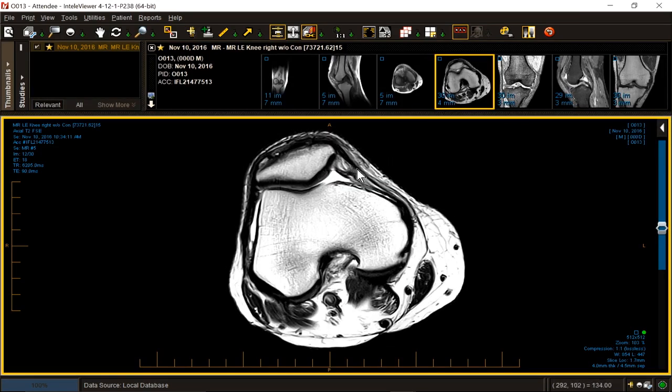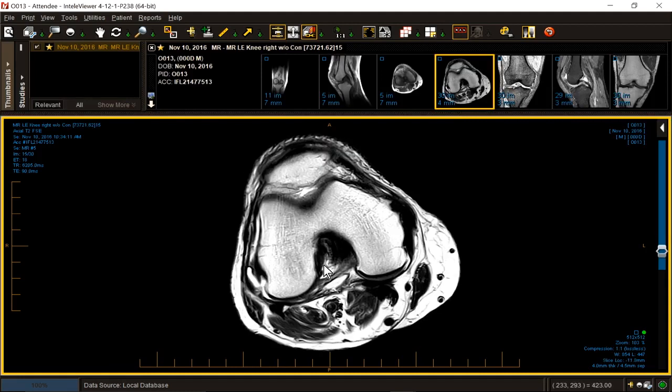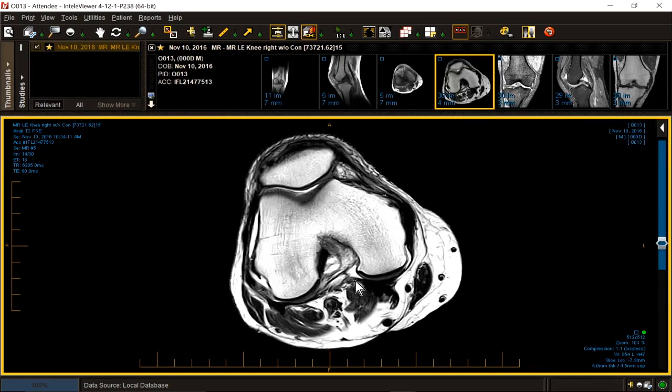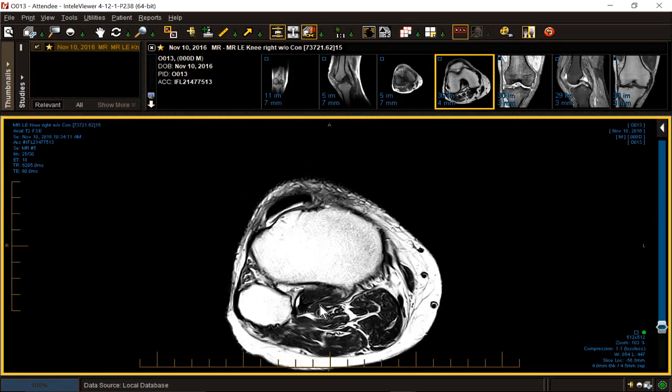We have a gorgeous MPFL. We have a nice thick but asymptomatic plica. We have a superficial medial retinaculum, which becomes layer number 1. The MPFL becomes layer number 2. We've got our ACL, femoral end. It's a beauty. We've got our PCL. We've got our TCL. We have our oblique popliteal ligament. We have our direct head of our semimembranosus corner, which contributes to the oblique popliteal ligament. So does the lateral corner. It gets complex. We've got the neurovascular bundle. It's great.